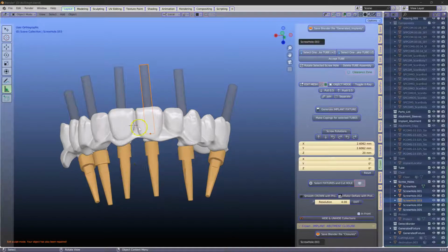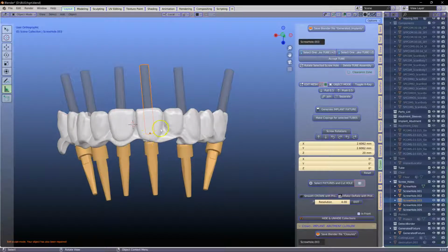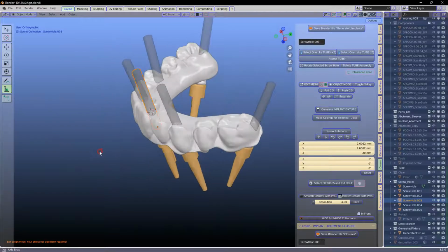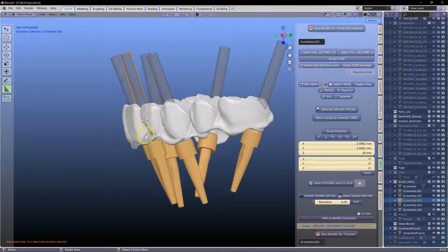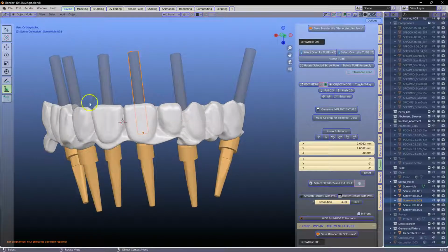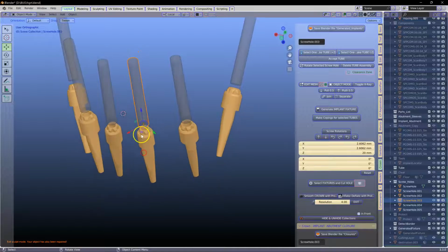Now, what do we do when we've got an implant abutment which can swivel around, like a multi-unit abutment, where we can set the angle at a random point, so we don't rely on an angled abutment itself? If we have an angled abutment, we know that the x, y, and z coordinates have been set according to our scan bodies.